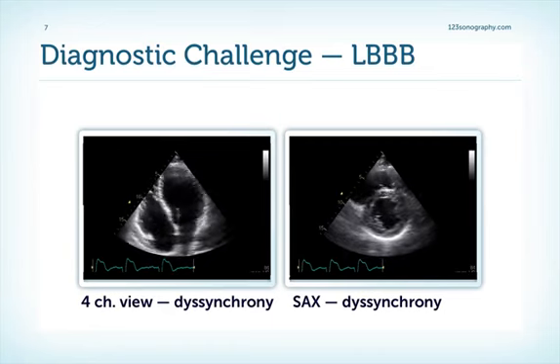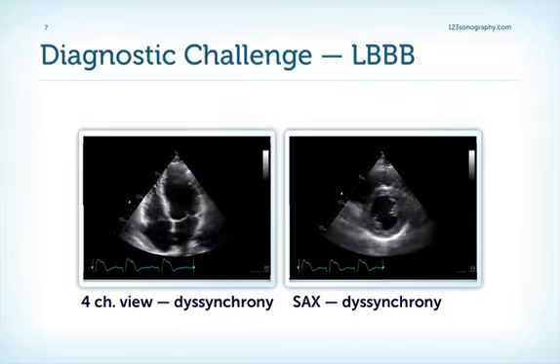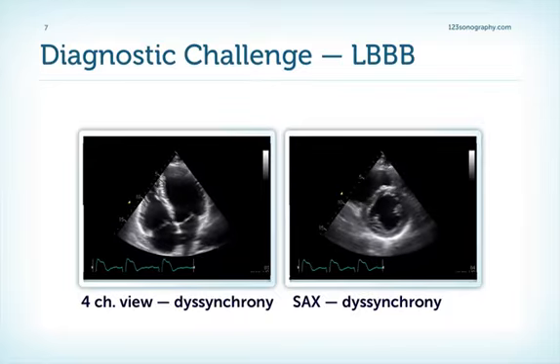There are a number of diagnostic challenges. One is the left bundle branch block. I want you to take a look at these two image clips of the same patient and then decide for yourself if you think that left ventricular function is normal or abnormal.